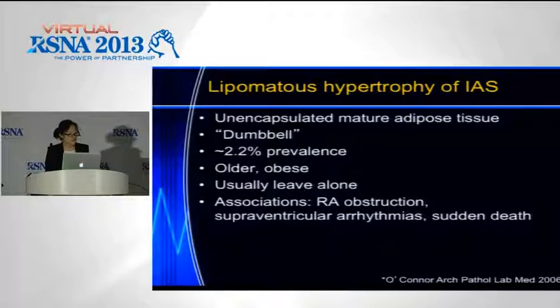We can see it's pretty common. It occurs in older patients and more obese patients, and it's usually an incidental finding and something that we want to leave alone. Very occasionally, it has been associated with right atrial obstruction and arrhythmias.